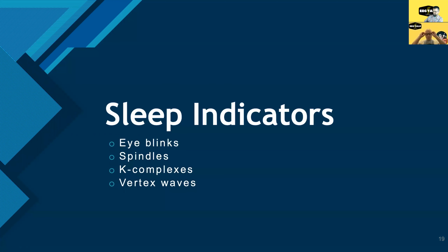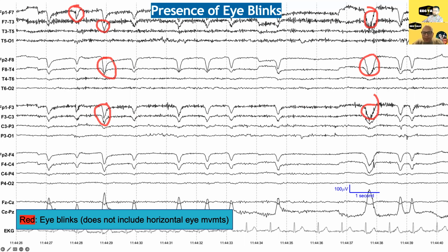Oh, sleep. So this person has a lot of blinks. They must really like blinking. Blink, blink, blink, blink, blink, blink, blink.